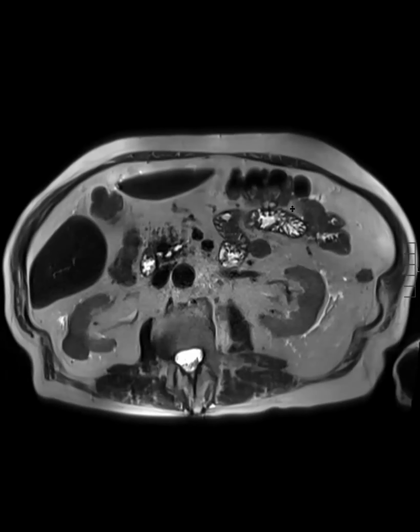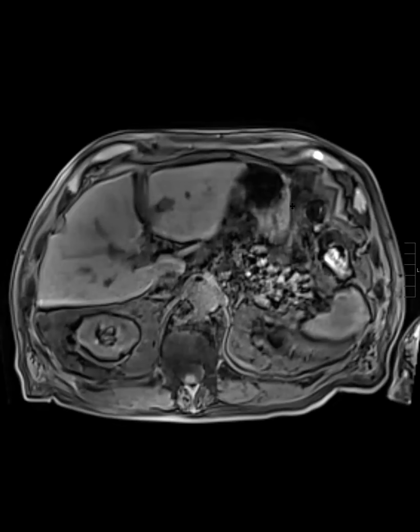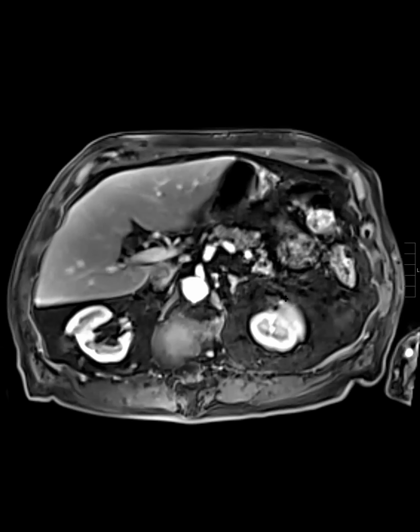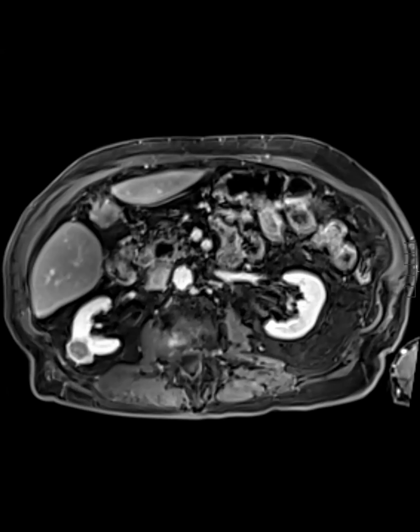So now this is what it looks like. I wonder where you would end up on the clear cell score. Oh yeah, yeah. I'm starting to use that clear cell likelihood score, I think it is. Yeah, yeah. How is it good? How do you like it?